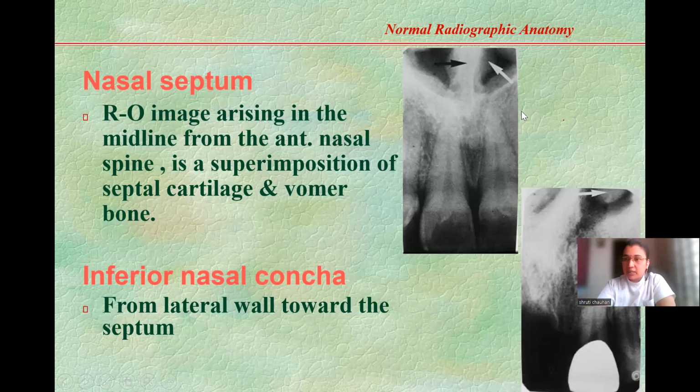The lateral fossa is a radiolucency near the apex of the lateral incisor. Over here, you touch and feel it. There's a small depression there. So that is why we need to know that in this area you may see something. That does not mean that the tooth is infected and you just pull it out or you do an RCT for it. It is a normal finding. It will be seen in every person. So it is a landmark.